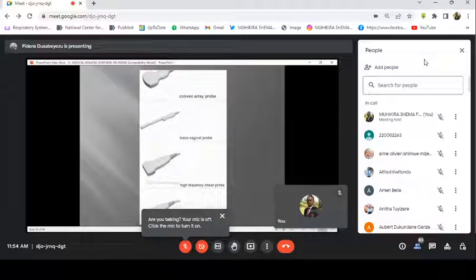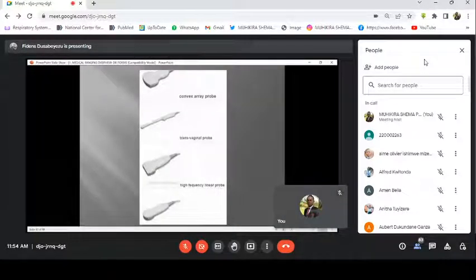So those are the different probes I have told you. There are many. This is a curvilinear convex probe for abdominal, transvaginal and transrectal use. There is a high frequency linear probe for superficial structures, vessels, Doppler, small things, subcutaneous nodules or masses. This is for 3D imaging, for example in obstetrics. There are cardiac and endoluminal ones. They are different probes, transducers or probes, okay?